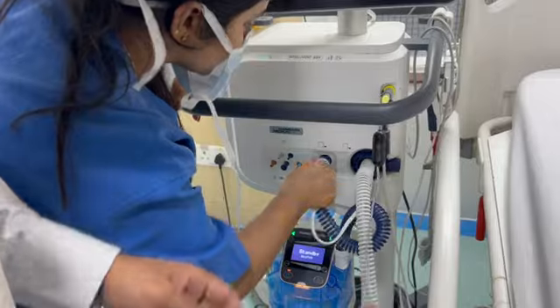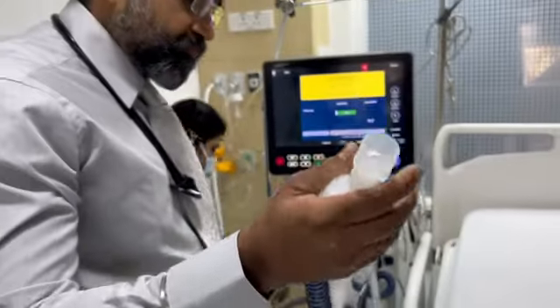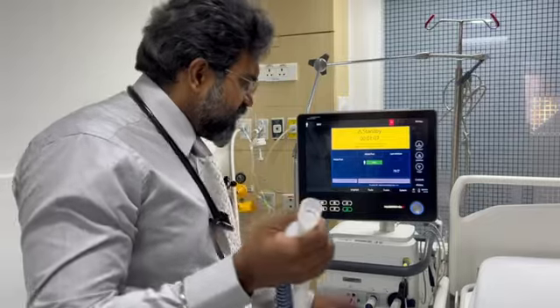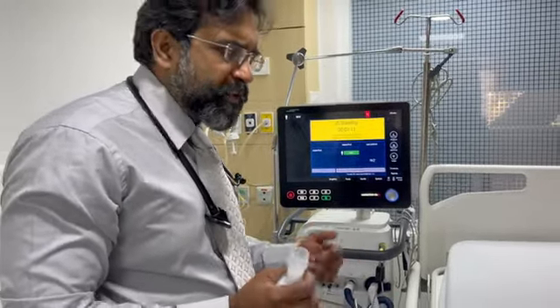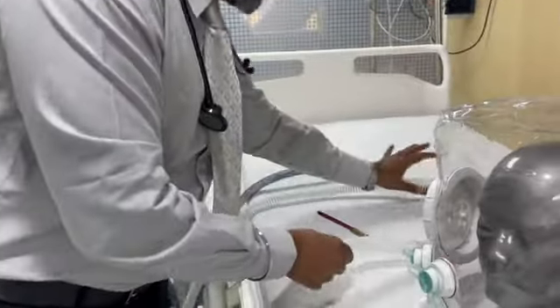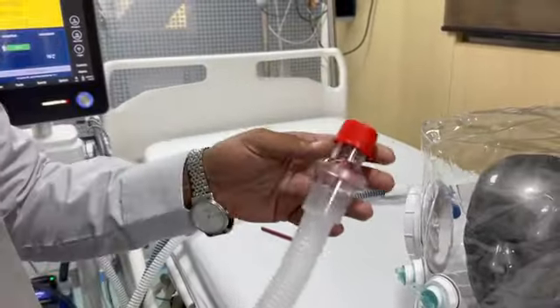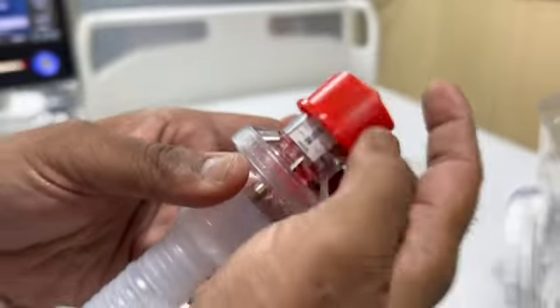So this is the Hamilton H900, where we have now connected the high flow circuit over here. But here you must remember that this is only flow, this is not pressure. We want to now give pressure also, and for that we will need a PEEP valve. So this is a PEEP valve, an external PEEP valve that we have over here. This is a PEEP valve which shows 5, 10, 15, 20. It has got the PEEP that is over here.